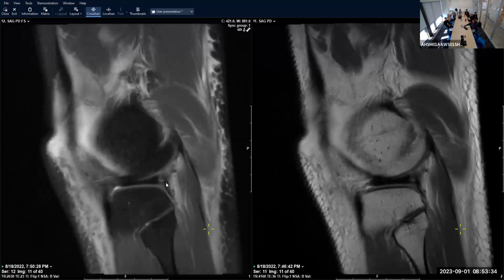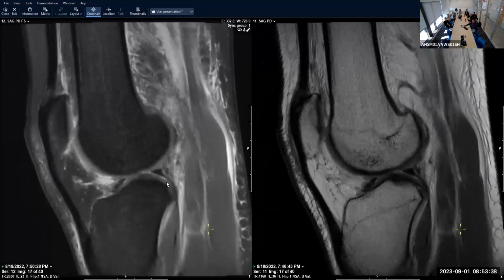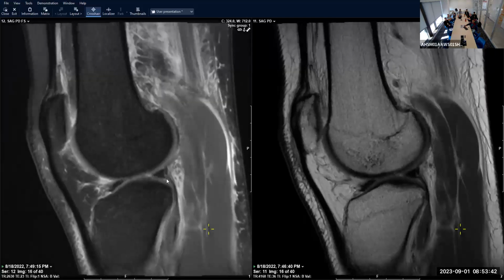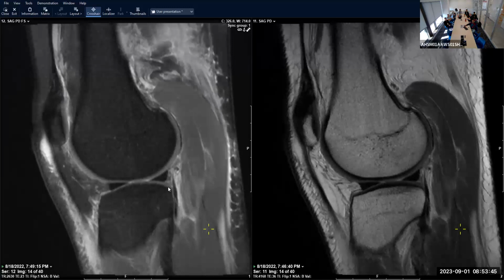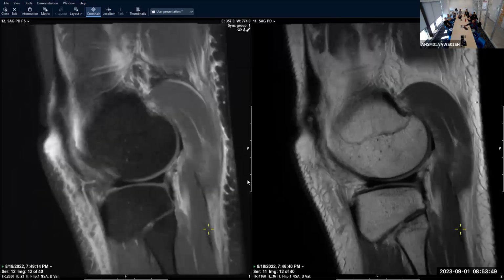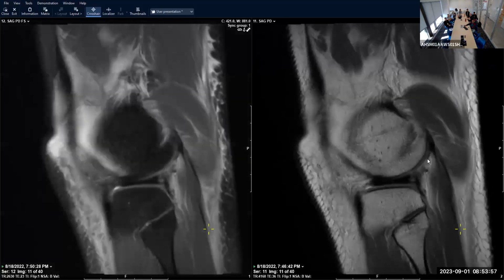Lateral meniscus looks pretty decent. Popliteus tendon coming through here, not bad. Here's that meniscofemoral ligament of Humphrey. It attaches, and this signal stops basically there. So this is probably not a Wrisberg variant. Normal. This arcuate ligament back here. So you see this is your lateral genicular arteries. Anterior to that, you're supposed to see an arcuate ligament, which sometimes we catch, sometimes we don't. Posterior to that, you see your popliteo.